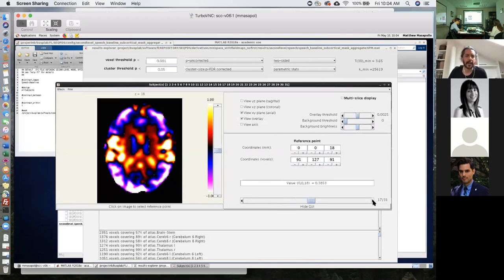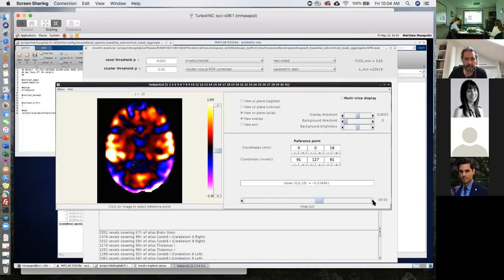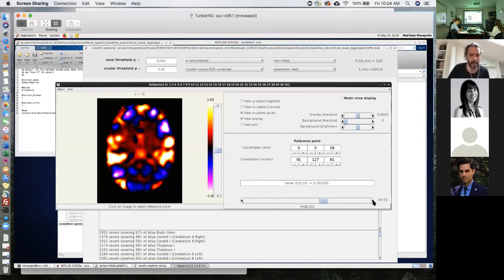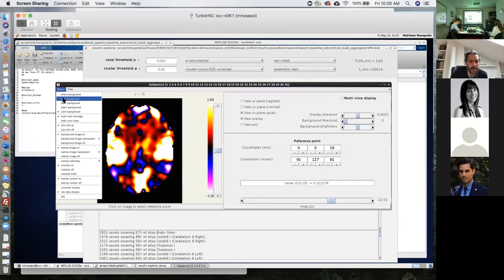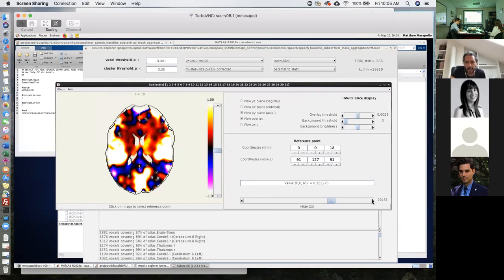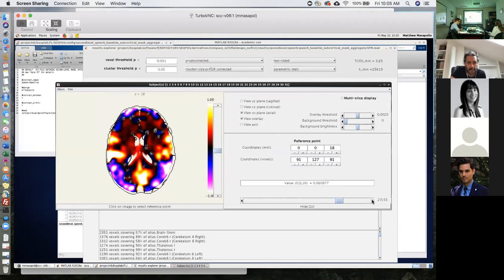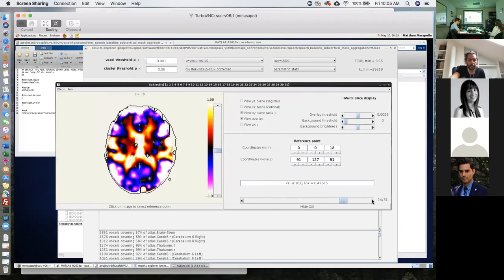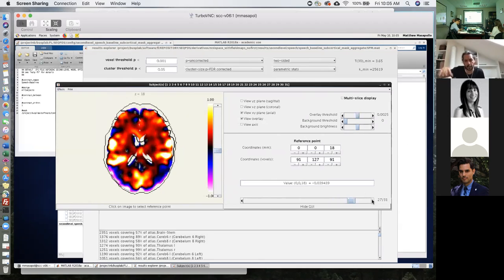You can change the raw to a smooth display so that we actually see the background in there. It's fine. We will see the boundaries to give us the information that we want. So clicking again on effects, change the last option from raw to smoother display, and then just move across subjects. That boundary that you see in black is the actual within-subject mask that has been used. If you lower the slider that is just the anatomical slice, to look at the more inferior portions where we were talking about the cerebellum.